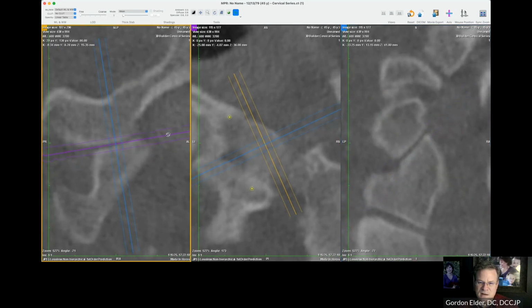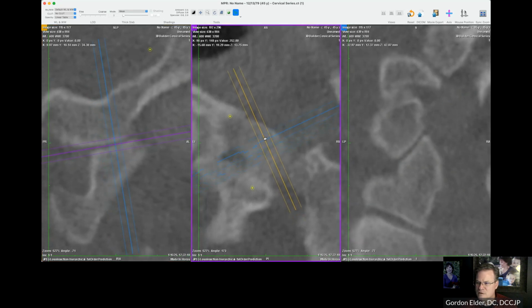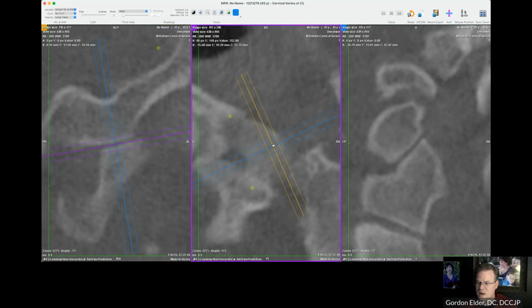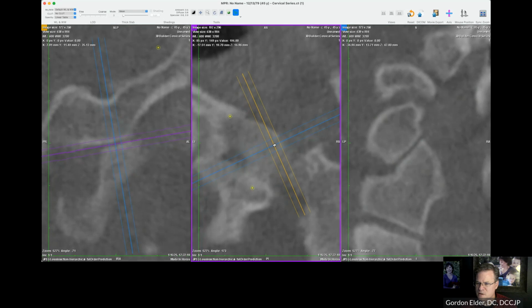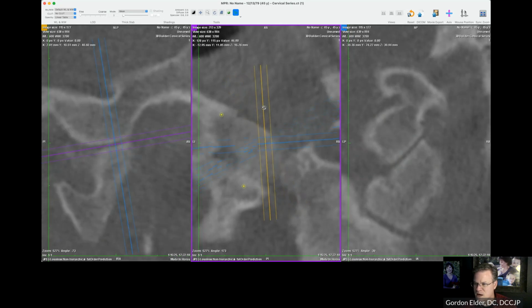So it looks like a much clearer picture. And this is probably the one I would take for the report. It's just super clear. I'm pretty sure I'm in the right spot. Now, if I'm unsure, I can move back and forth. Okay. I can make sure it's parallel to the joint surface. As long as I know where in parallel to this line is furthest away, I can go to that joint surface and I can change that around a little bit.